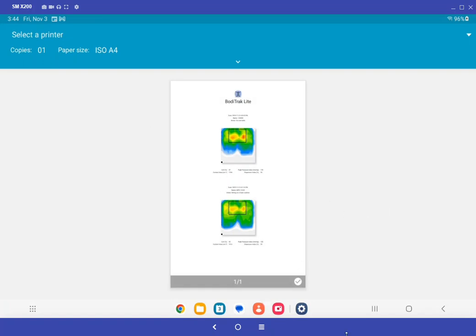And then you can use another little application called Zoto, which is included on the tablet, which is a little PDF manipulator. So you can open it in Zoto and then annotate your file and add more information to this, and then share it by email with interested parties, caregivers or insurance companies, etc.